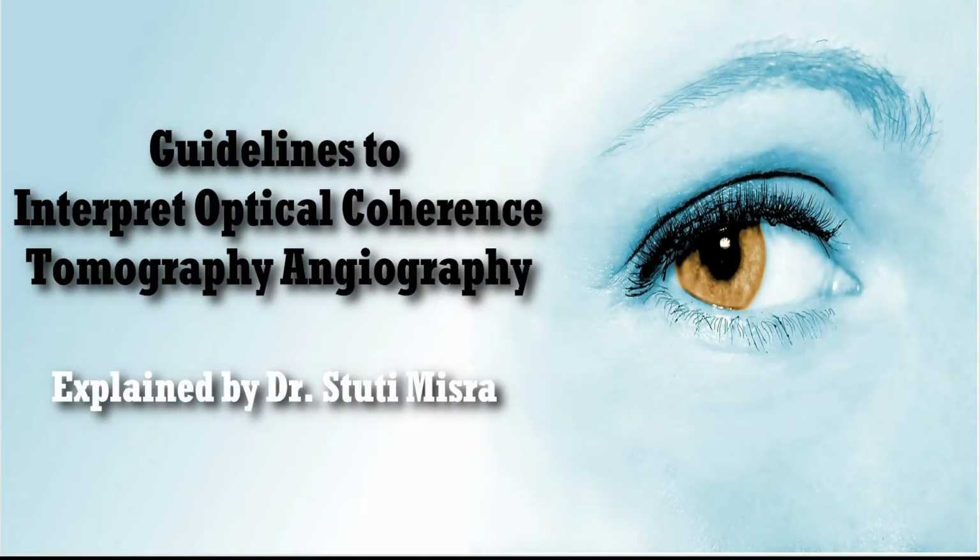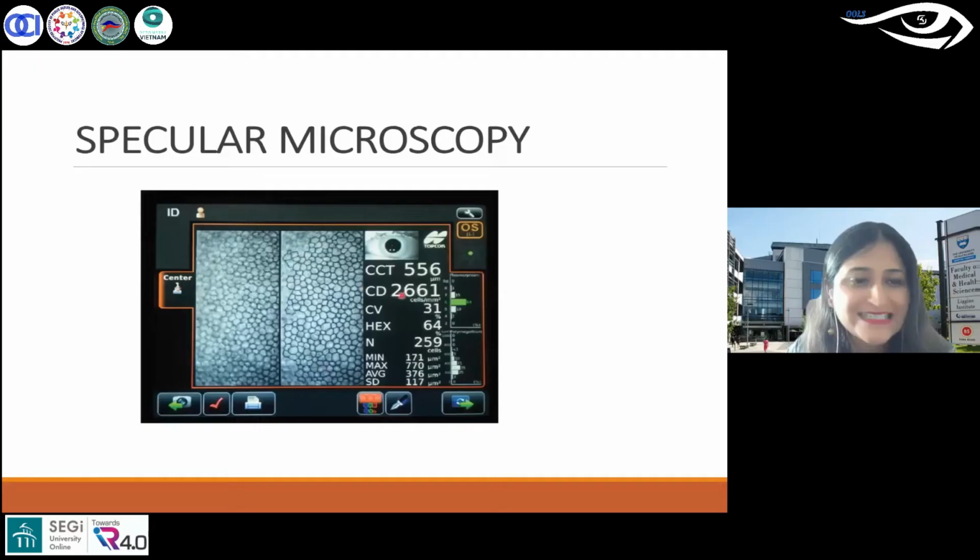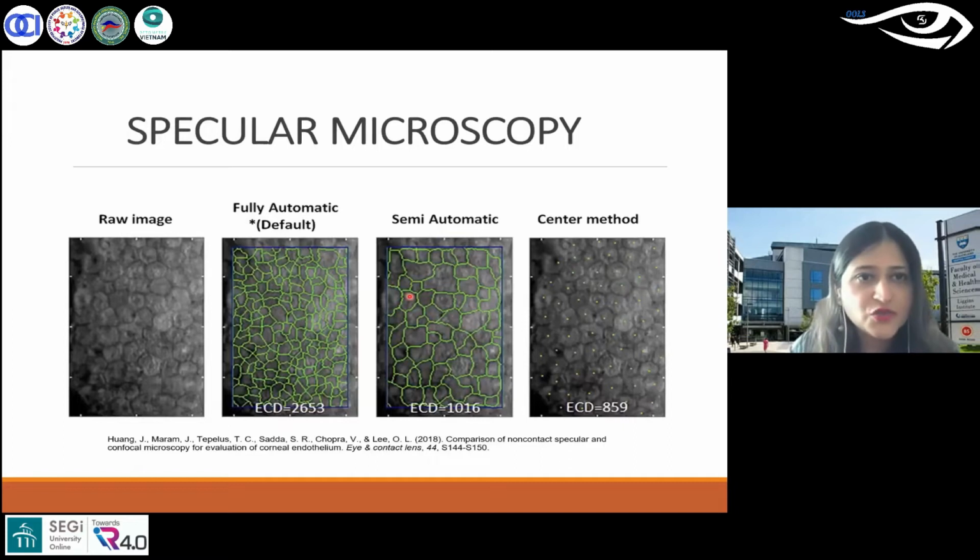It looks like it gives you central corneal thickness and CD, so that's just the cell density. As you know, approximately 2,500 to 2,700 would be normal, and it could reduce, of course, post cataract surgery, but it bounces back, which I'll talk about shortly as well.